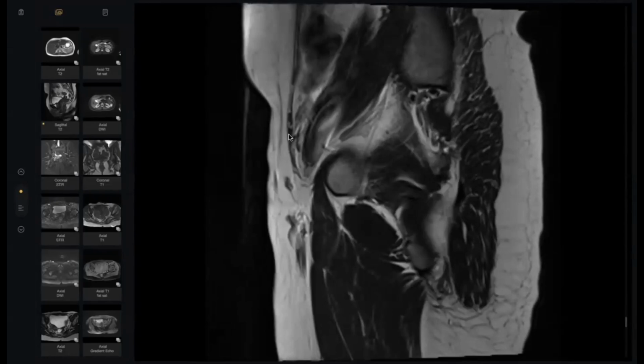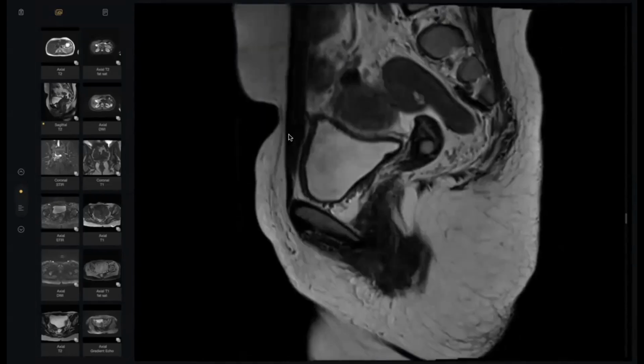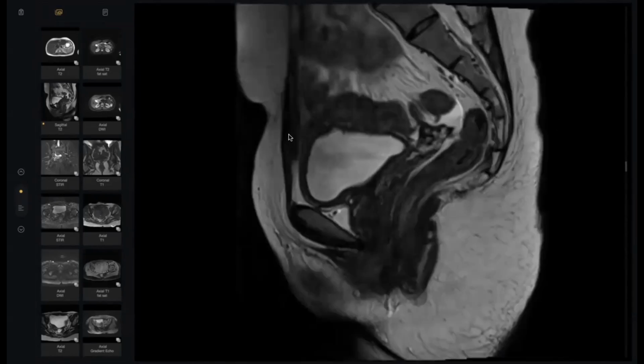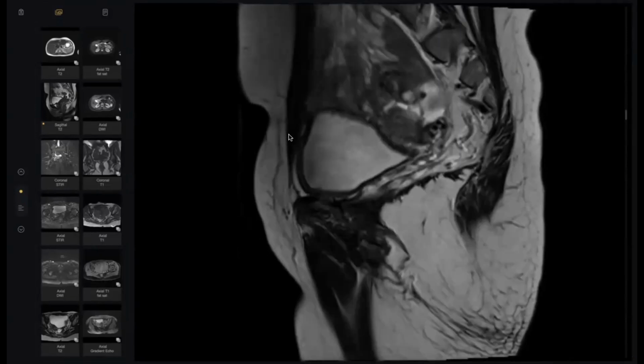No, sir. One of them is prominent with internal hyperintensities, and the other one is relatively smaller. So give me a differential diagnosis at this point, please. Up till this point, it can be bicornuate uterus with a single small horn. One of them is rudimentary or smaller. Very good. This is a rudimentary horn.